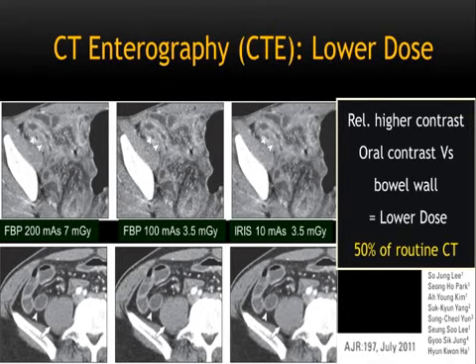But regardless, this is another low contrast situation where I would perhaps use lower mAs rather than lower kV. And the reason is that this is not a place where I have given iodinated or positive contrast. So lower kV will disproportionately increase the noise and may not help. And plus, most of the pathology is in the pelvis, where you have dense bones. You do not want to use too much lower kV when you are there unless you have a good iterative reconstruction technique.